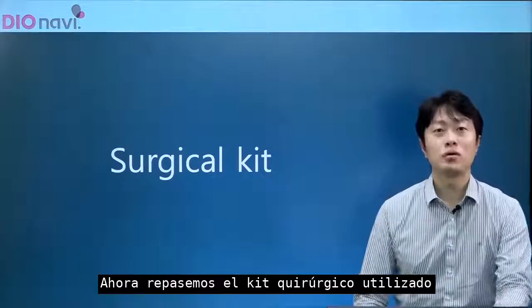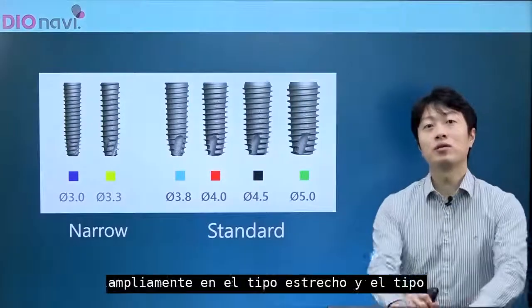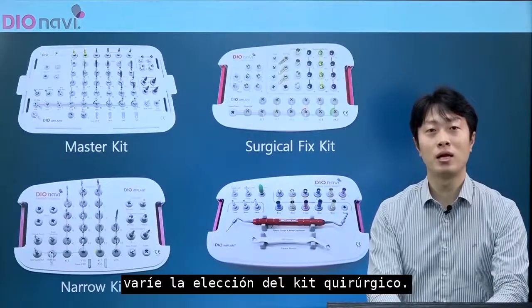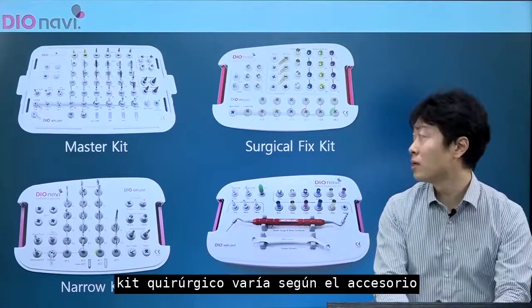Now let's go over the surgical kit used in surgery one by one. The DIOnavi fixtures are broadly divided into the narrow type and the standard type. Depending on the type, the choice of surgical kit varies. We need to pay attention to the fact that the surgical kit varies depending on the fixture.